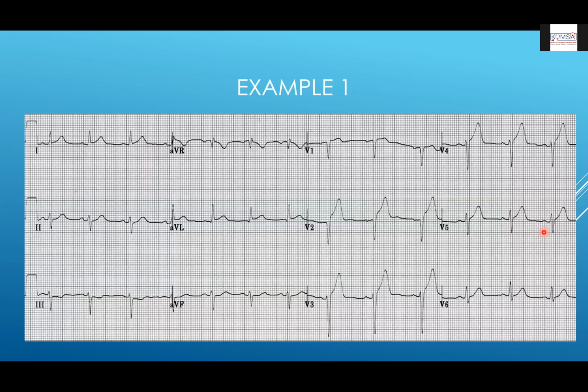So I may want to ask for a couple of participants. If anyone wants to participate, does anyone want to contribute and interpret this ECG for me? It's an ST elevation. No one's brave enough. I don't mind going first. Okay.